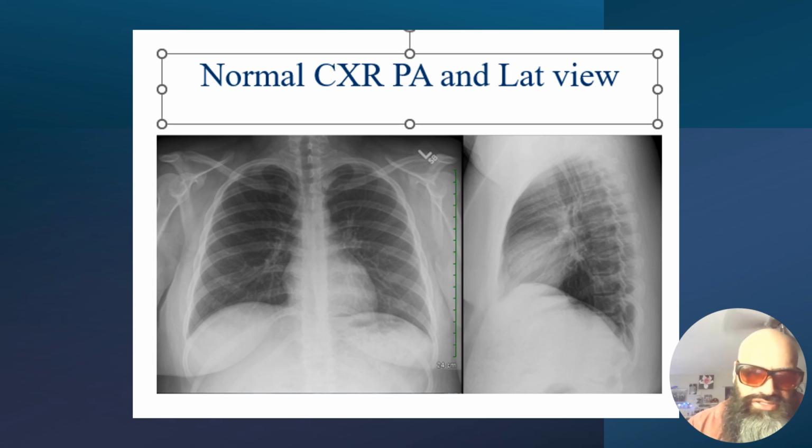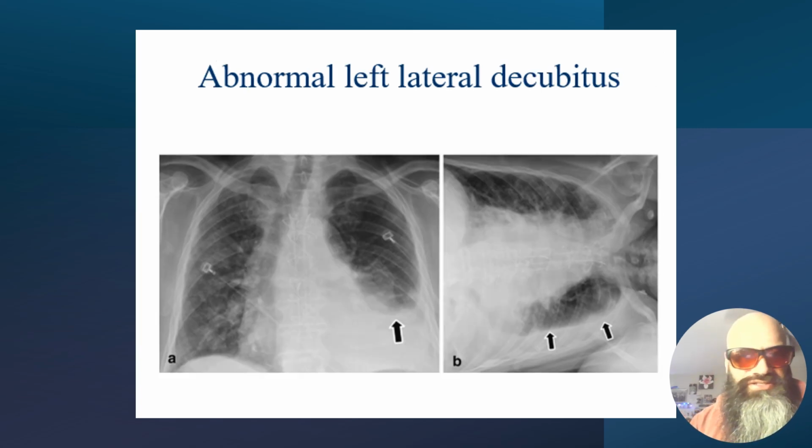This helps us determine if lesions are located within these anatomical blind spots that we discussed in class, because anteriorly could be hidden by a structure such as the heart or some sort of fluid density that is compromising the view, and that will lead to us looking at the lateral view to help us identify and locate the structure that is sinister.